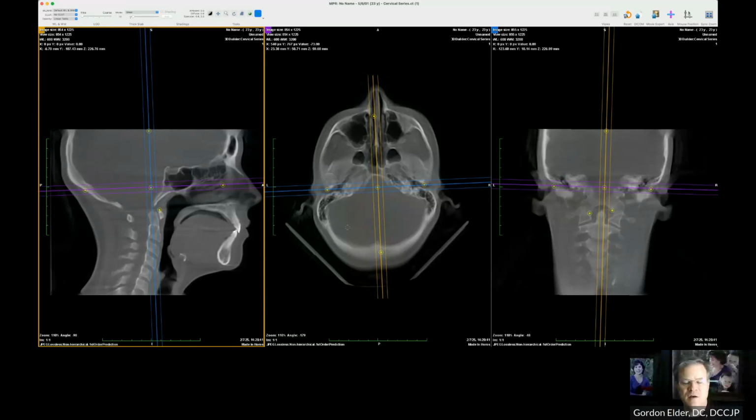I want to see if the hard palate line is actually equal to, or how close is it to the line between the corner of the eye and where the ear attaches. And if it's significant, I will have a correction factor so that when I walk up to the patient, I can add or subtract a few degrees. So how do we figure that out?